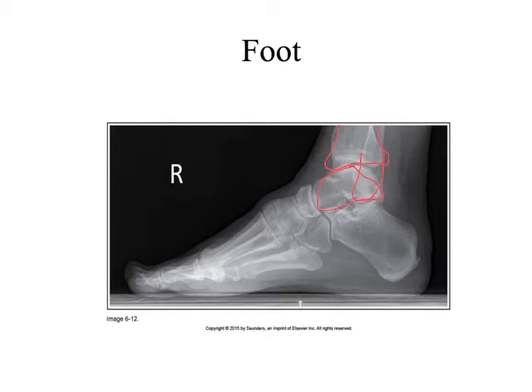So one measurement of this image here: with the prior two images we could not really adequately evaluate the calcaneus, right? So we want to make sure we've included the entire calcaneus on this image. With the prior two images also, we have the anatomy at a different angle to the image receptor, right? Now we can actually see some of the distal tibia and fibula on the image, right? So typically on this image, we're going to include maybe about 2 centimeters of those bones, right?